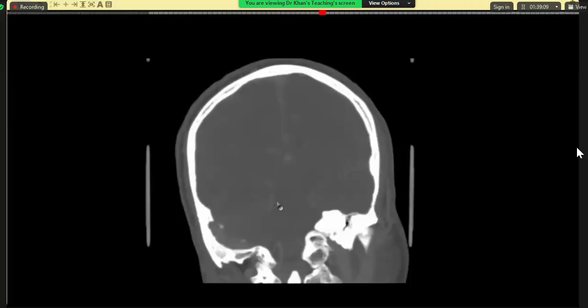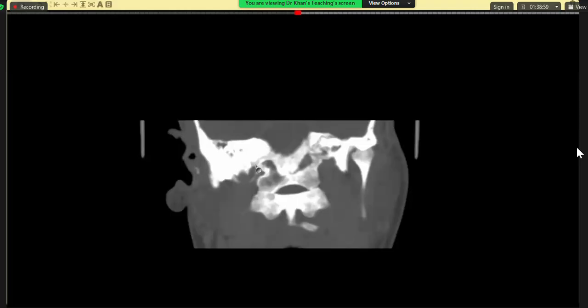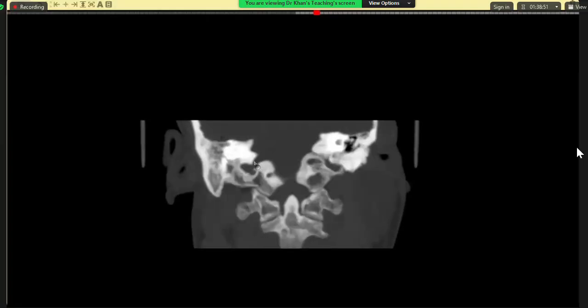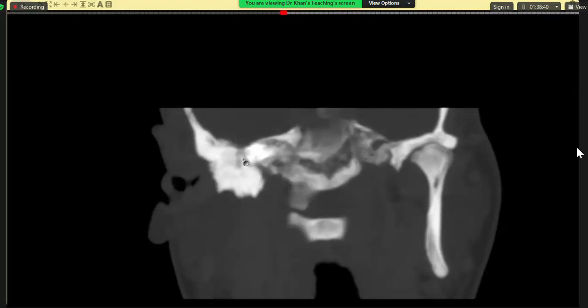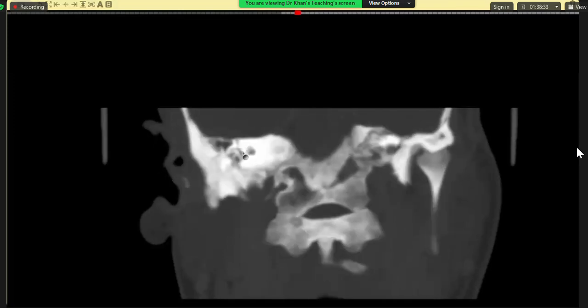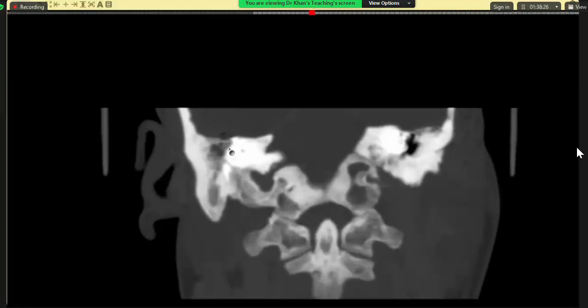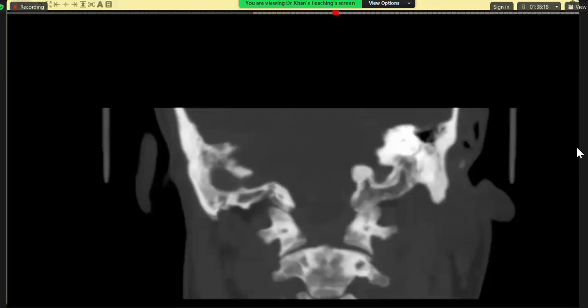And as far as anatomy is concerned, this was well picked up. If you see the anatomy which we have learned, in this particular case, because of time factor, I did not ask everything. But if you see, the ossicles are also attenuated. They are a bit eroded. And then there is tegmen tympani dehiscence, and if you go posteriorly you can see it very well. It was actually picked up by the candidate. So with otomastoiditis there is sigmoid sinus thrombosis and there is an epidural abscess.